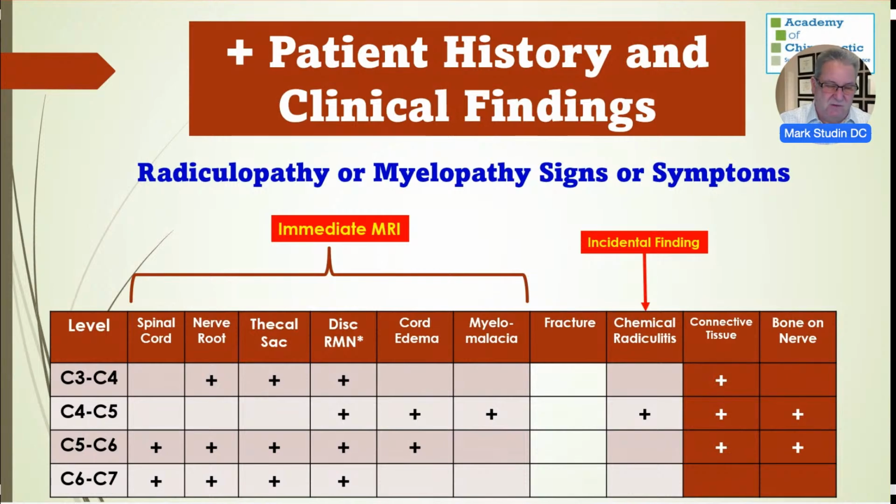That's nonsense. If that spinal cord is compressed, you're spinning the dice if there's no space for that cord to go. And you're spinning the dice, especially if you see signs of cord edema, myelomalacia is soon thereafter. Cord's going to start to die. And that die is die. It doesn't come back.